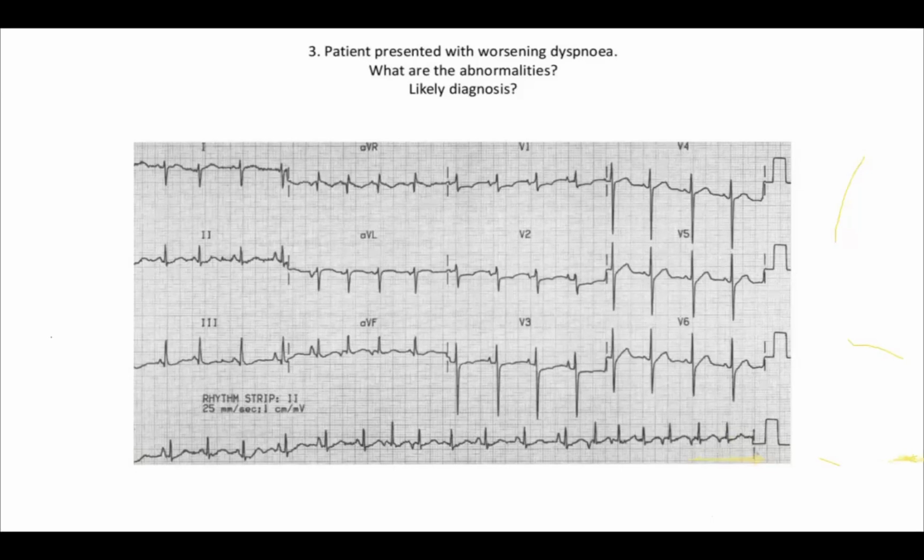Yeah. And if you see the rhythm strip, you can see there's... So is this sinus tachycardia, Lamai? What do you see here? Is it sinus tachycardia, or is it something else? So you don't see particular, same unimorphological P waves, isn't it?